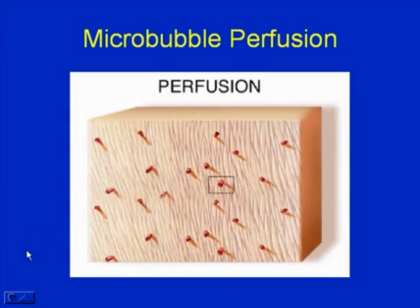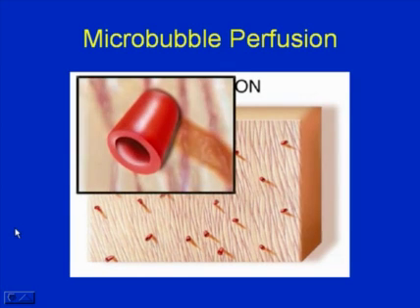Now here's an animation showing what I'm talking about. We would grab a small capillary and we would image the microbubbles shown in blue through the blood flow inside of a tumor.